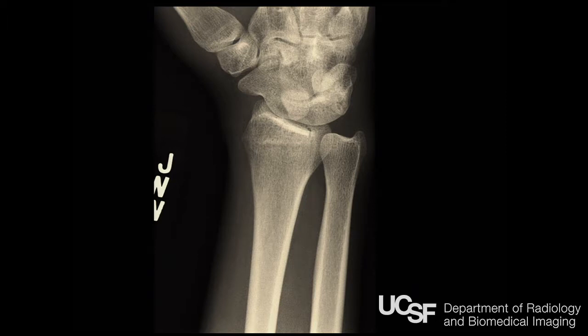This is my favorite fracture. Now remember, the difference between a great call and a subtle finding is whether it was you or your colleague that missed it. And so this is a fracture I find gets missed a lot. You look very, very carefully right here. Look at every wrist for this fracture. You will see a lot of fractures that a lot of people will miss if you look right there. It's a real common fracture right at the ulnar side of the distal radius, and often it's just a hairline radiolucent line.